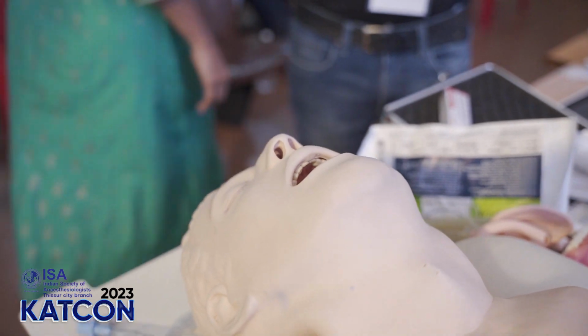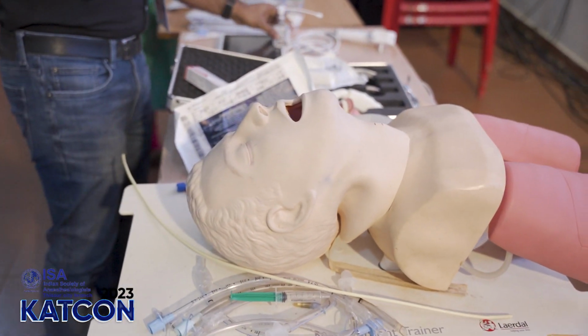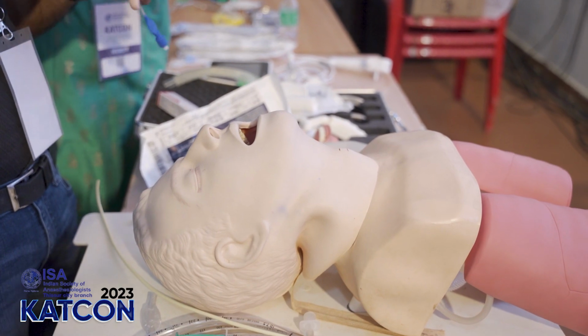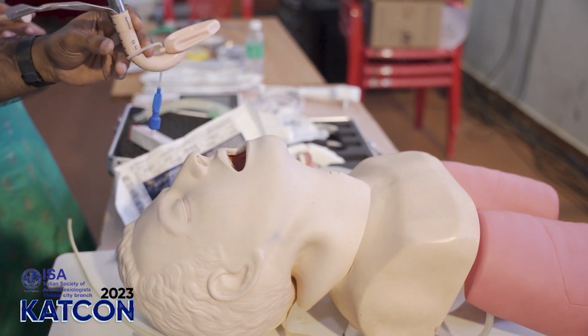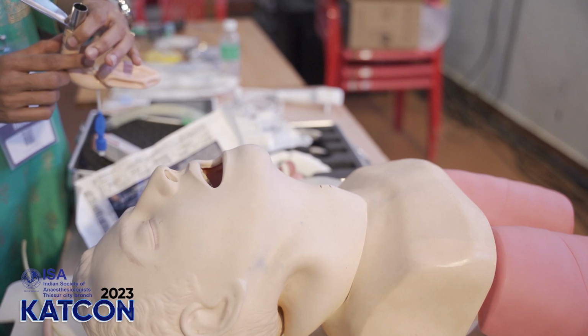Next one is an intubating LMA or fast track LMA. These are becoming obsolete now because of the arrival of advanced video laryngoscopes. It is identified by the steel handle. Next.